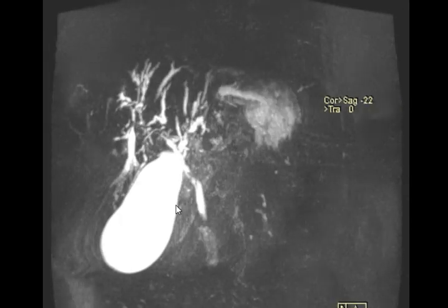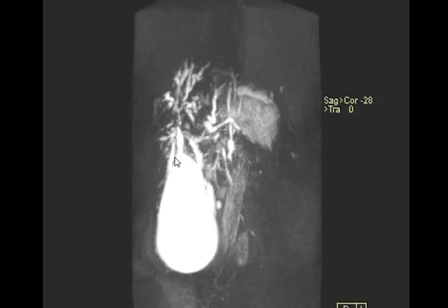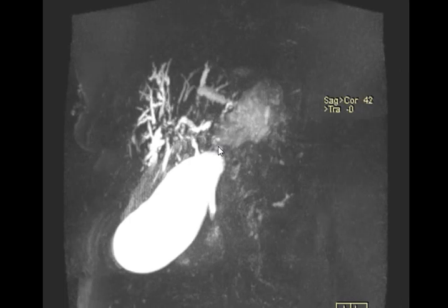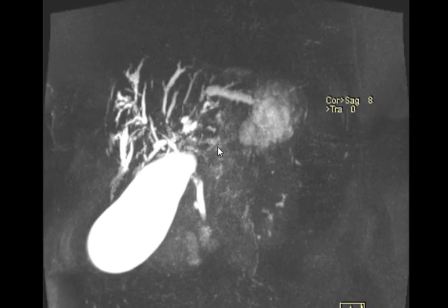Wait, let's approach it step by step. We have splenomegaly, we have hepatomegaly, we have a prominent portal vein. We don't have signs of cirrhosis: no ascites, no nodularity, no masses. In the MRCP, which is the key in this case, we have a dilated intrahepatic biliary tree with multiple innumerable short segmental narrowings everywhere. Just rotate the image, you can see narrowing here, here, and here.